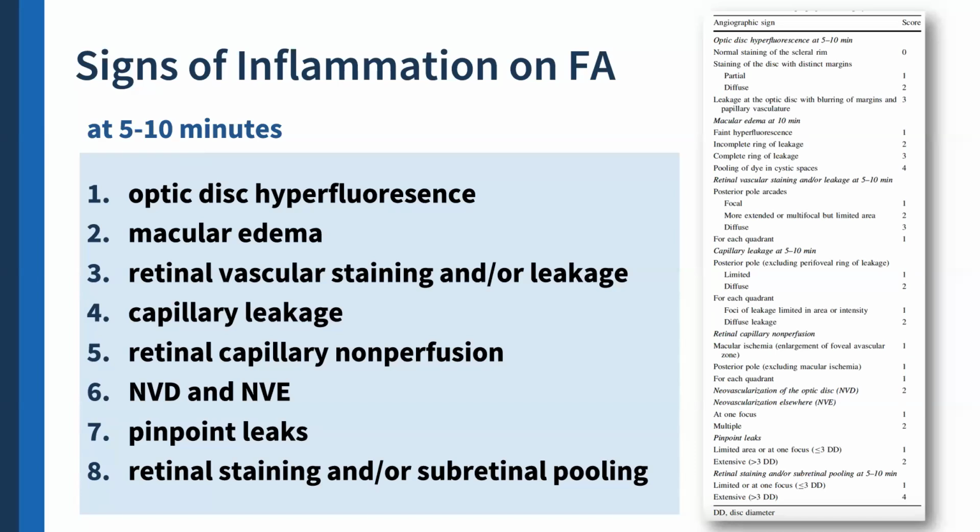It's important for things like retinal vascular disease, such as retinal vein occlusion, because you want to see the flow of blood within the arteries and veins, and whether there is delayed filling. But inflammation will not show yet in the early films. So the late films are more important to us. That's why you grade inflammation at 5 to 10 minutes, the later films. And thus, the transit eye is not so important.